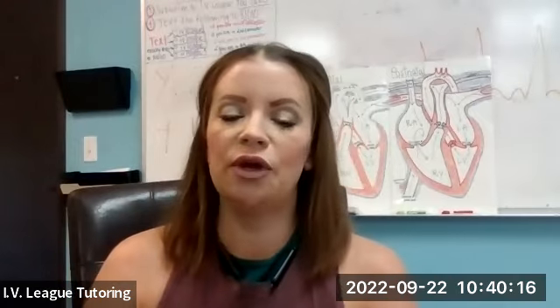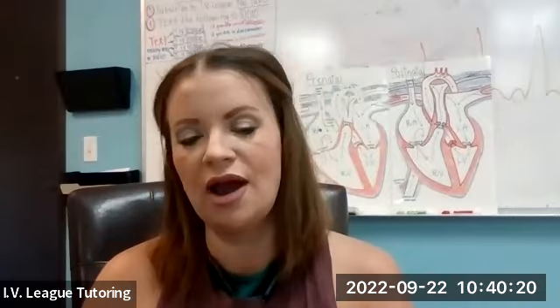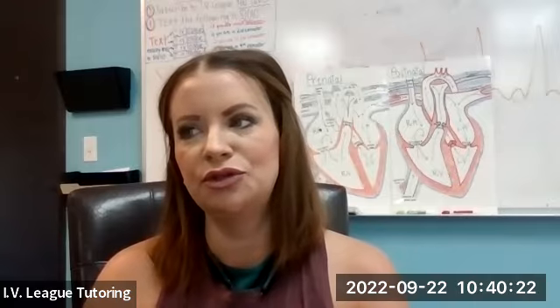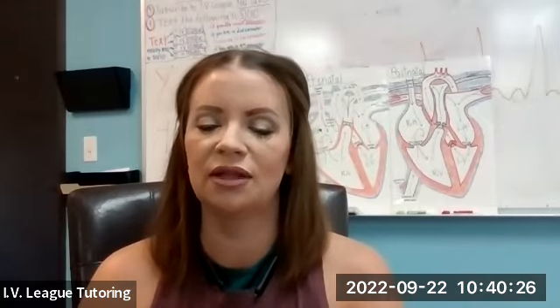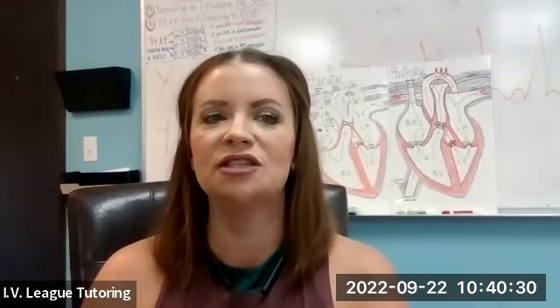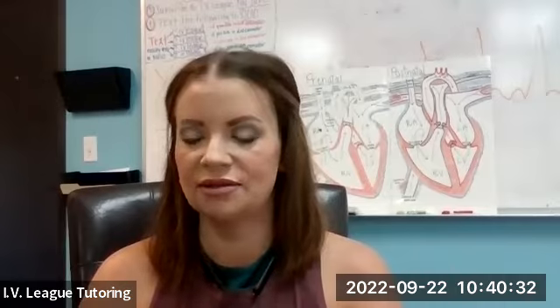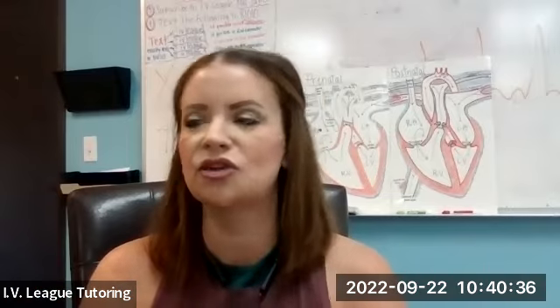So in a normal sinus rhythm, heart rate has to be 60 to 100. The PRI has to be 0.12 to 0.20. The QRS has to be less than 0.12. Good. Is this patient stable? Yes. That's where everybody should be living, and there's nothing you need to do for it. Let's go to sinus Brady.